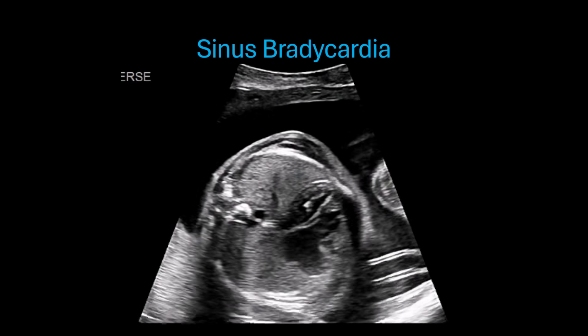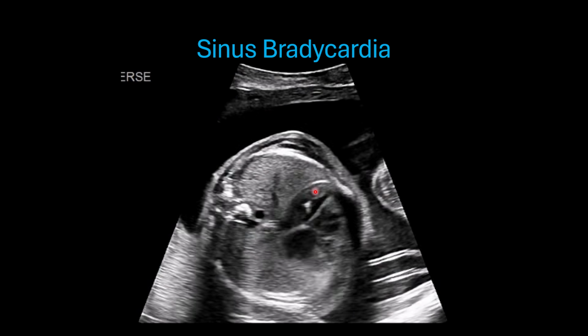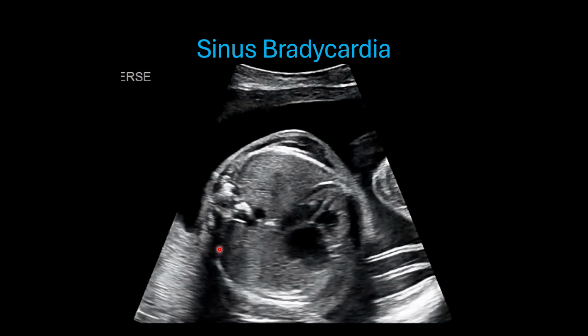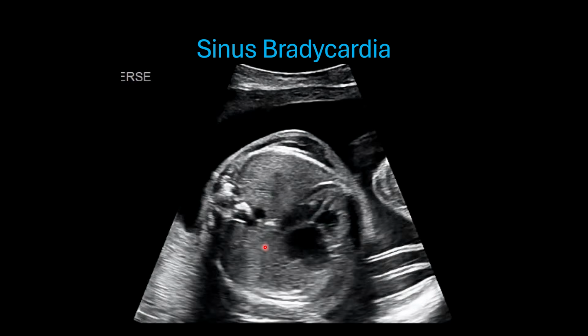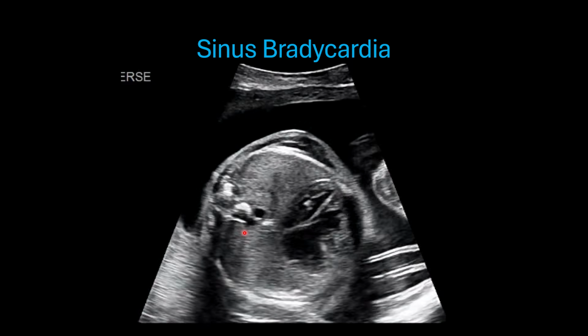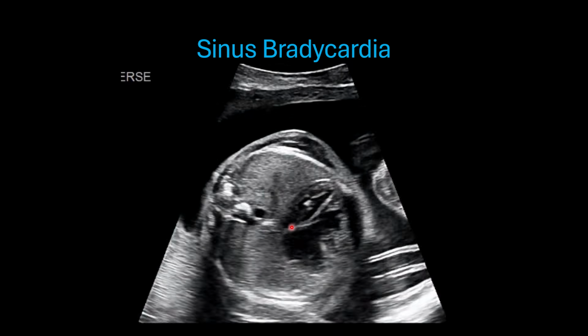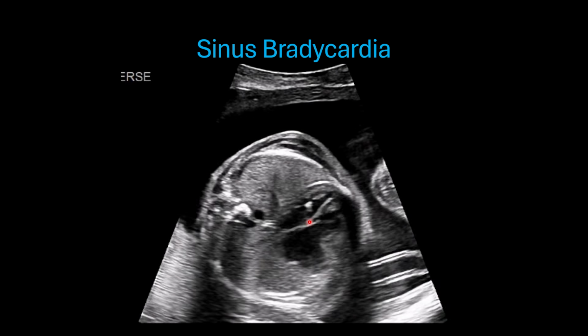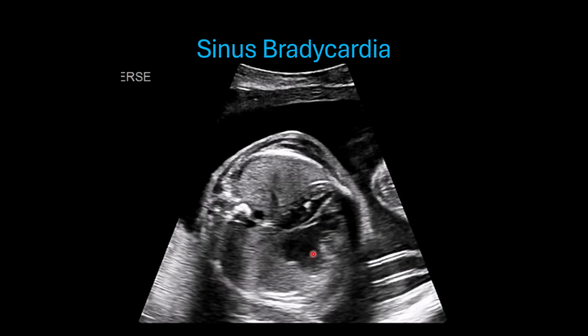Now, this is a good example of sinus bradycardia with one-to-one conduction in this four-chamber view. This case just happens to be a left atrial isomerism heterotaxy case. You can see here dilated azygous vein. This fetus has interrupted IVC with azygous continuation, but an intact heart. So no atrioventricular septal defect as we commonly see, but some right heart enlargement here.